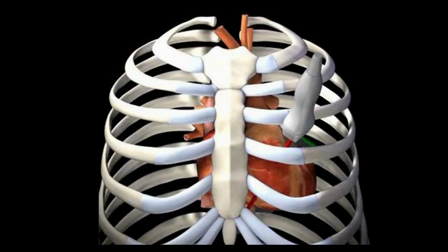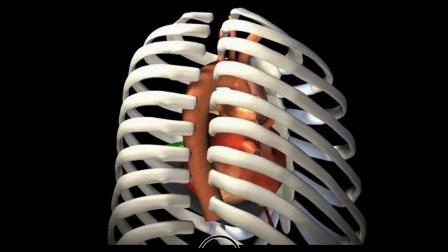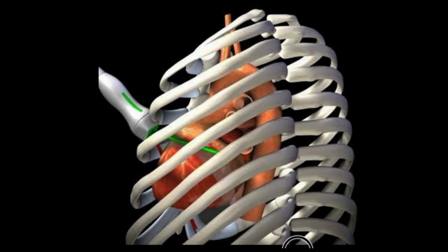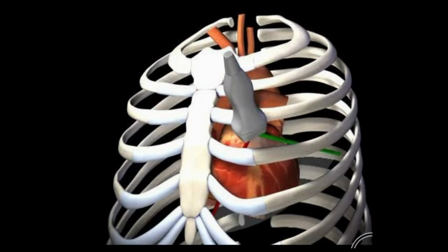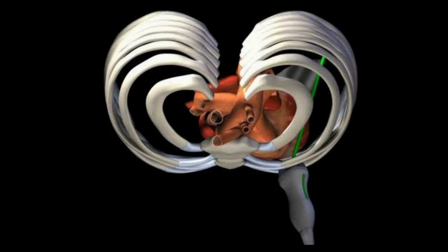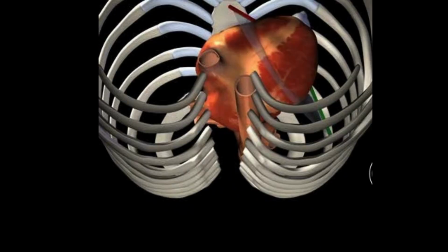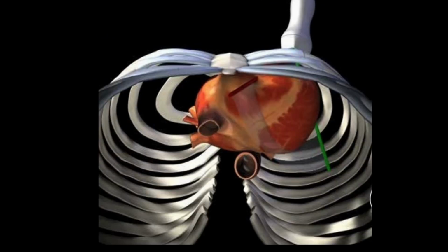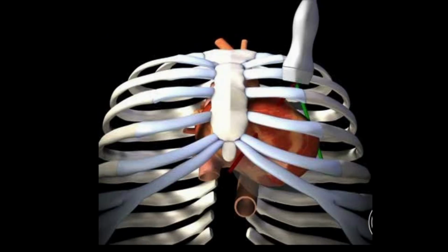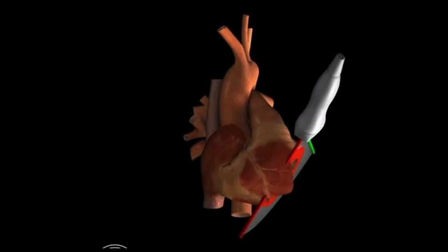Just like our previous 3D model, you can see here that our green light again belongs to the probe indicator in this particular model. So you can see how it points essentially towards the left shoulder of the patient, and how the ultrasound rays are going through the heart in a transverse, or short axis, fashion. So we're kind of slicing that upside down cone in half and having an upper and lower half, right?